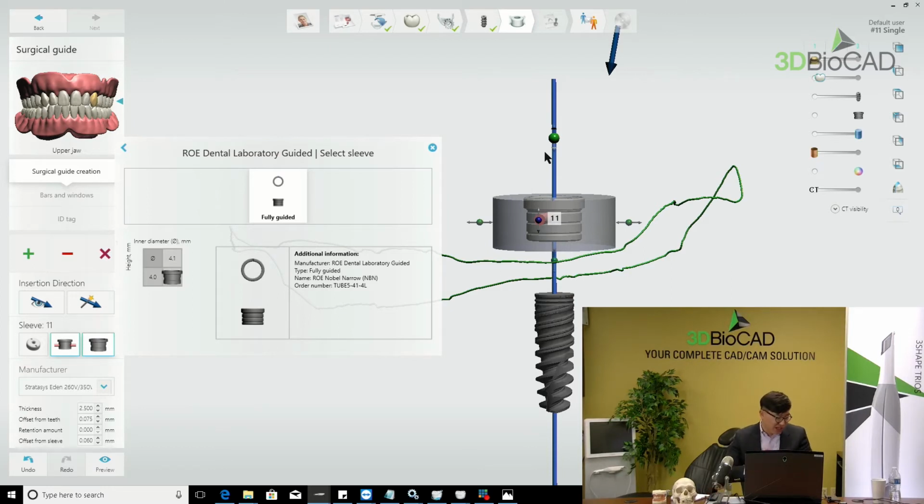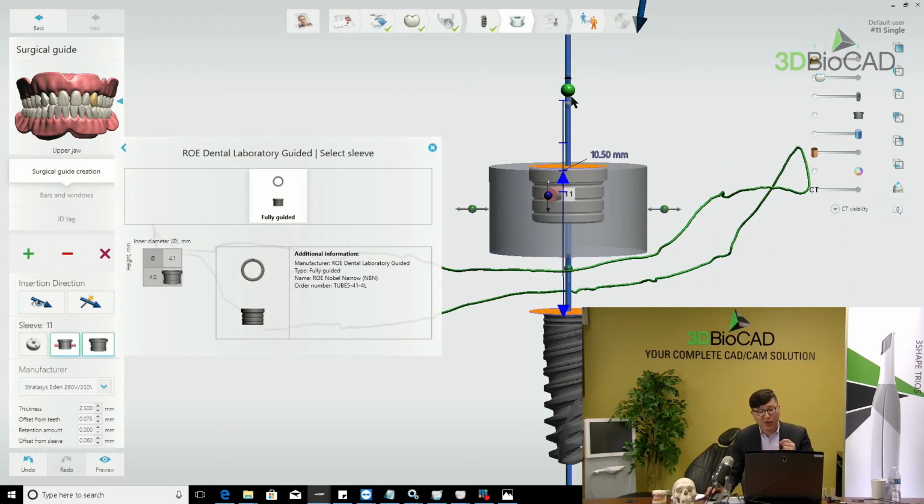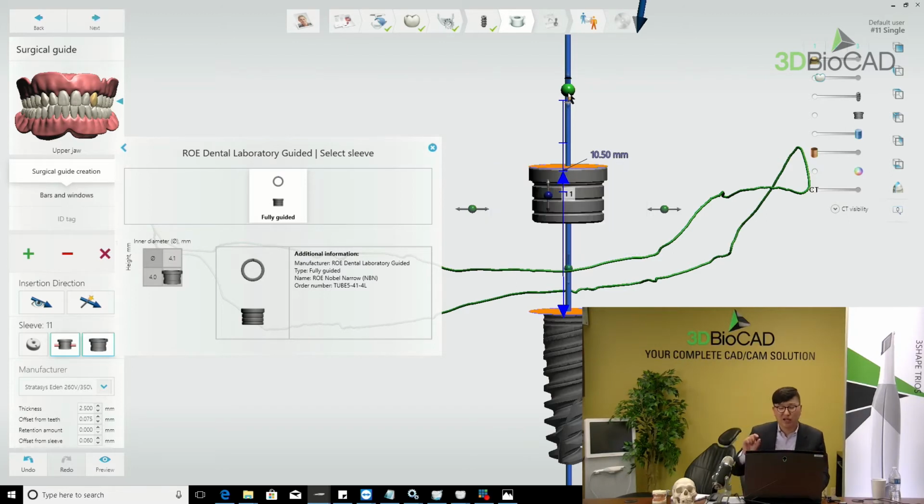Because all the drill kit is already preset for the drill depth. So if we change the drill height, like the sleeve height, we should let the doctor know. The Implant Studio software, after planning and the guide are all done, will generate the drill protocol document and then the surgical report document. So the doctor can check it, and then the doctor can choose the right drill length.